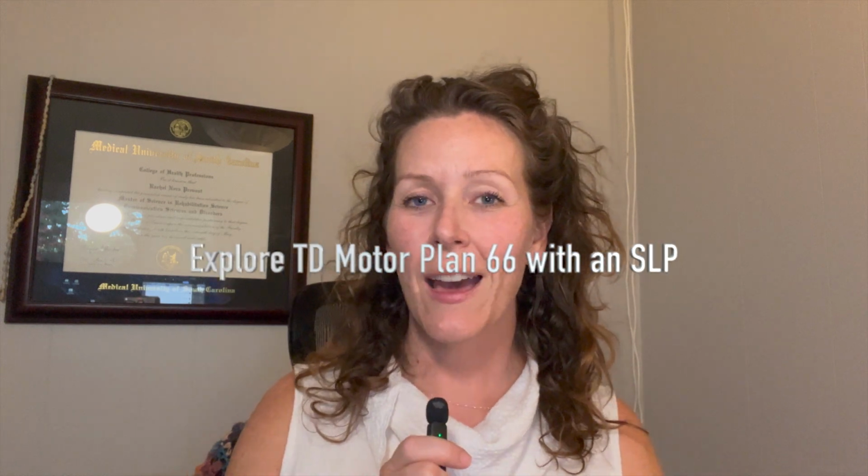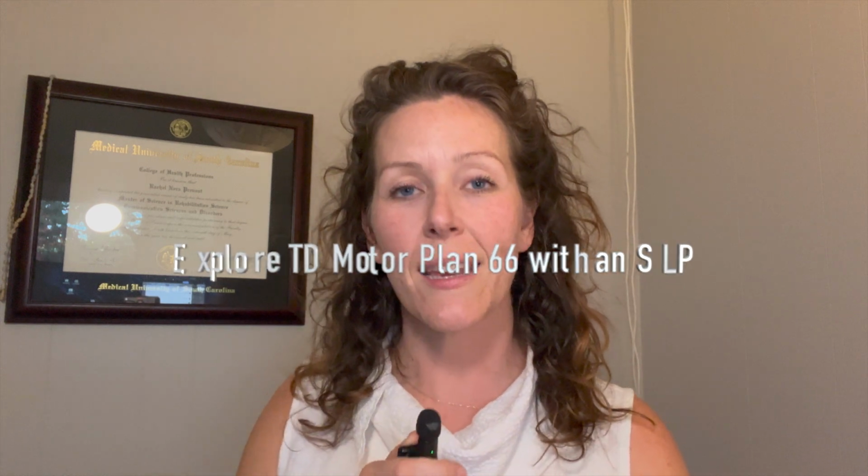My name is Rachel. I'm a speech language pathologist, and today we're going to be looking at the AAC, or Augmentative and Alternative Communication app, TD Snap. This app has multiple different profiles that you can choose from. In this video specifically, we're going to be talking about the MotorPlan 66 layout.